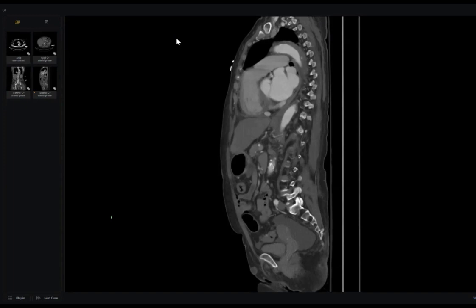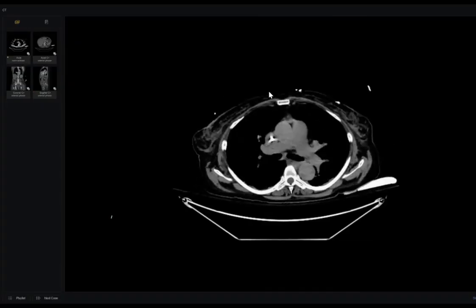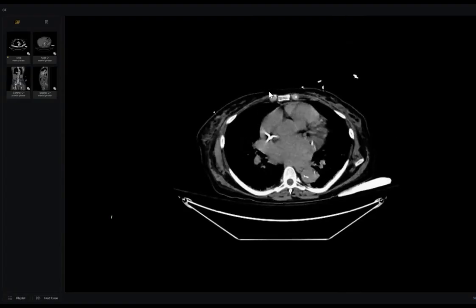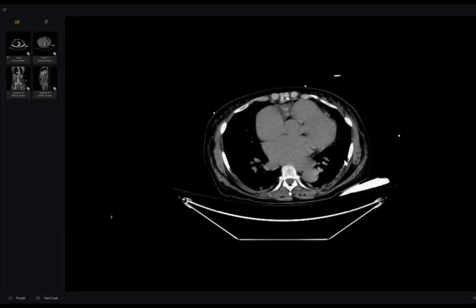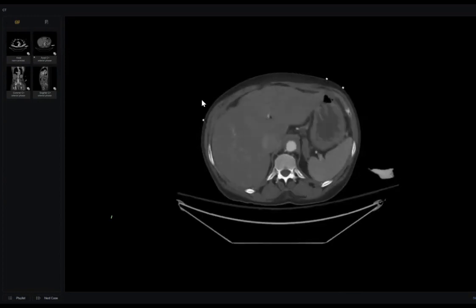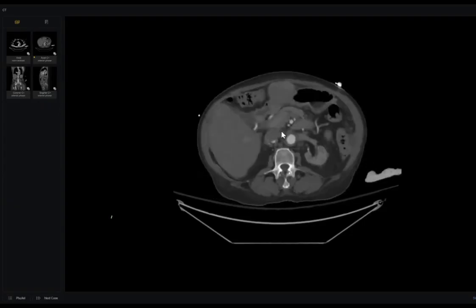Okay, first, thank you for picking this up in the non-contrast. Very great pickup. See, my colleagues, the patient is 50, and it is very important to look at calcification. Calcification is eccentrically displaced, and the patient has chest pain. If you look here, you will find some subtle mural hyperdensity. So our colleague asked for post contrast, which is very clear. There is something abnormal, at least in the wall.